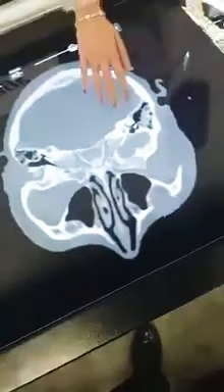And what's most interesting to me is you can load in your own patient's CT or MRI scans, and from there you can get a 3D model of what you're seeing. So here we have a post-operative scan of a patient with a brain aneurysm, and this is the actual CT that was provided. You can go ahead and slide through the CT and see exactly where the clips were placed as well. So if I go down here, it'll show where it is. And same functionality as before.